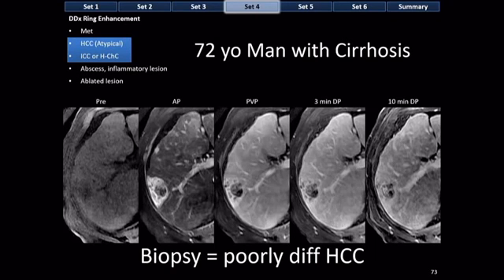Remember that Dr. Clausen taught us that progressed HCCs are overt cancers, overt malignancies in which the cancer cells are actually invading vessels and have the capacity for metastasis. So these little nodules we see in the area subtended by the perfusional change are satellite metastasis from an overt malignancy that has the capacity biologically for metastatic spread.